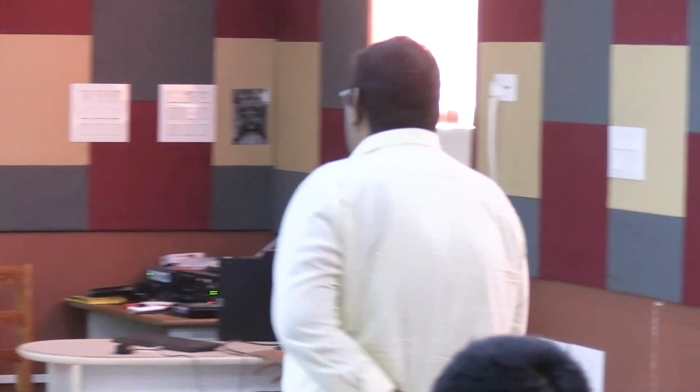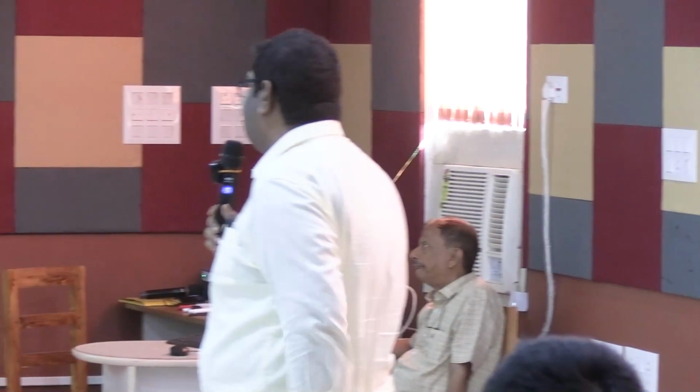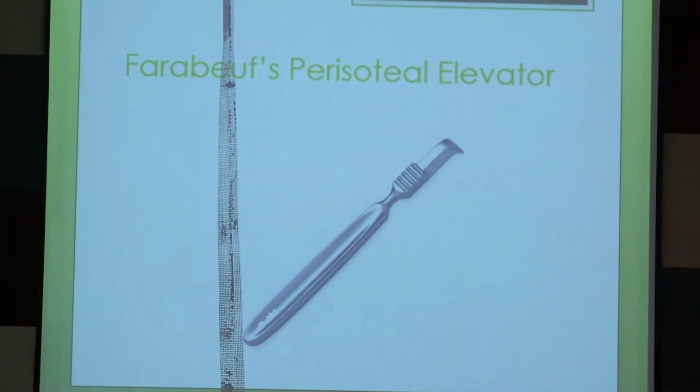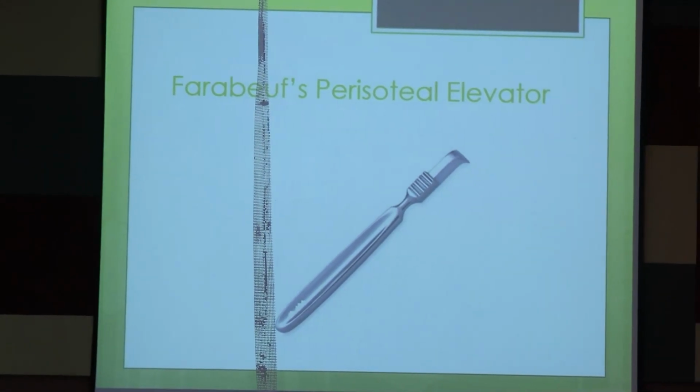During ear surgeries, okay, we elevate the periosteum from the mastoid bone, so it is used in mastoid and tympanoplasty ear surgeries, okay? How it is held is difficult to show without the instrument, but this serrated part is to place the thumb, okay, and with this we just press and rub to lift the periosteum, okay? So this is also an important instrument.